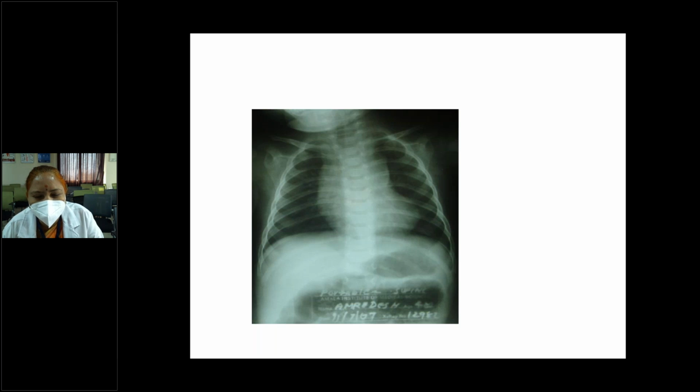It's a commonly given X-ray in the exams. Very, very common. If you won't answer, they won't pass you also. It's a very fundamental X-ray that I'm showing. Anybody voluntarily? Just try once. Plain X-ray.